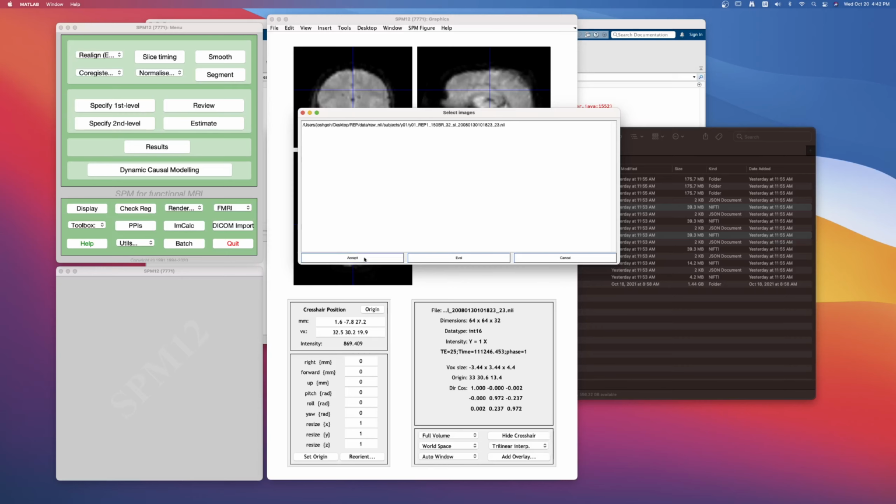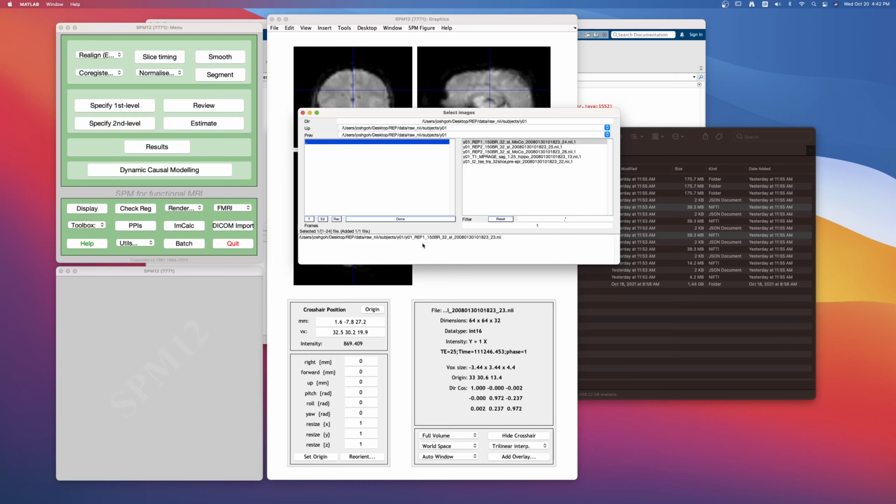We click Accept, and I want to look at it as one image, all right, rather than as separate different images, which I could do if I were to call frame 1, frame 2, frame 3, okay, in different lines. But I'm selecting this image now, and removing the frame reference from it. And so what this means is that SPM will open this image as a 4D image rather than as a 3D image. And you'll see what I mean when I click Done here.